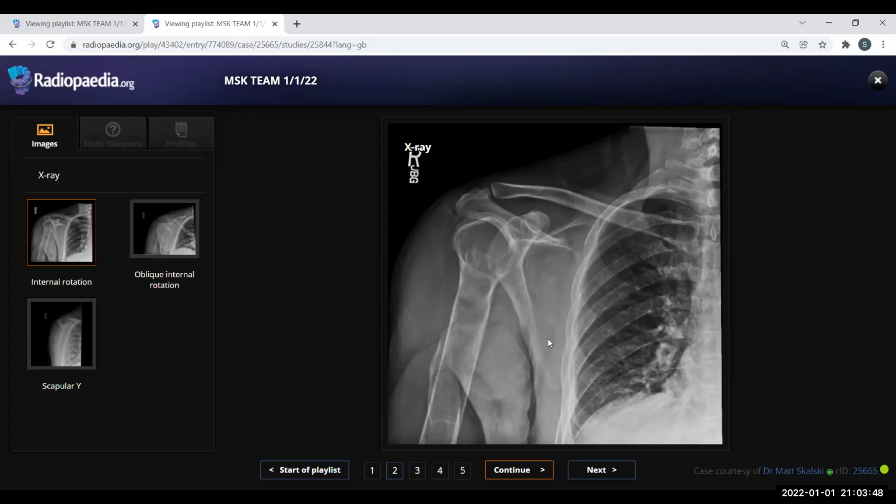Do you want to ask for something else before giving me the differential? Can you pinpoint the lesion for me? I guess this is the lesion. You're showing me the proximal end, right? Can you show me the lower extent of the lesion, please? I guess there is a pathological fracture, so the lower extent is not visualized. So I would request a view of the whole arm. Very good. Your next step would be to ask for an X-ray of the whole humerus.